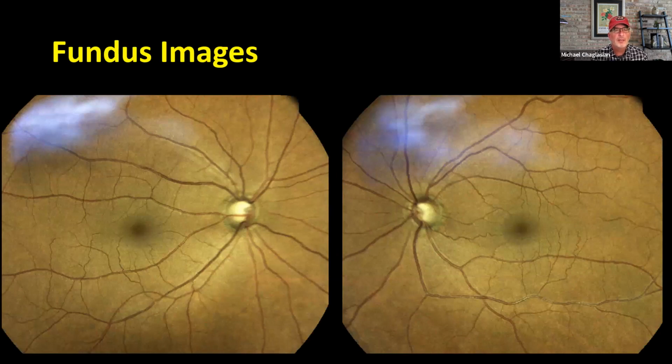These are the wide field fundus images. The optic disc is a little bit blurry on some of these sometimes, but I do take a look at the retinal nerve fiber layer if you can see it, and sometimes it shows up pretty well on this camera. The disc margin, the cup, again, not a perfect device for glaucoma disease in my mind, but it's one of the cameras that we use in our general care service, and under optimal conditions, it can do a pretty good job. And again, we all have different cameras with different settings and different outcomes. So just be aware of that.